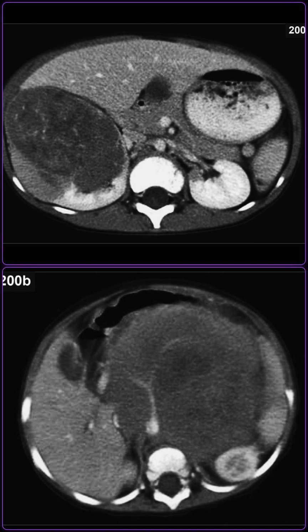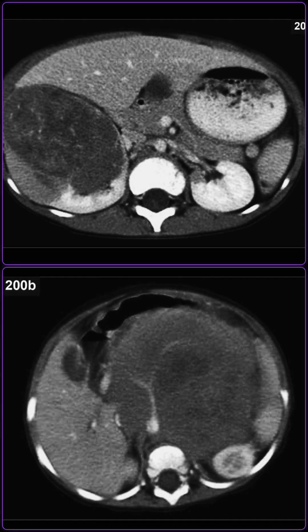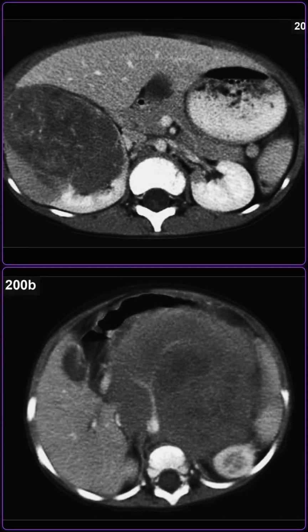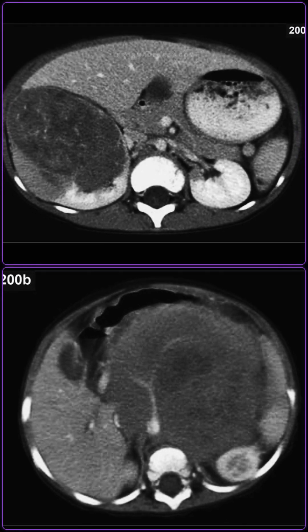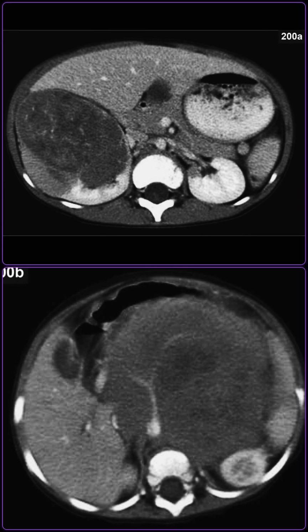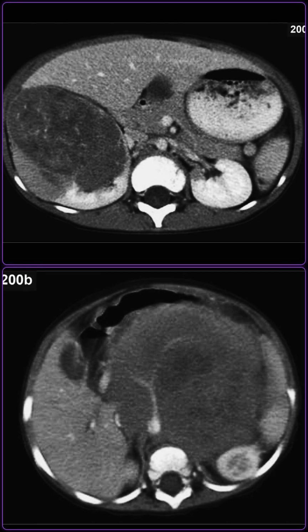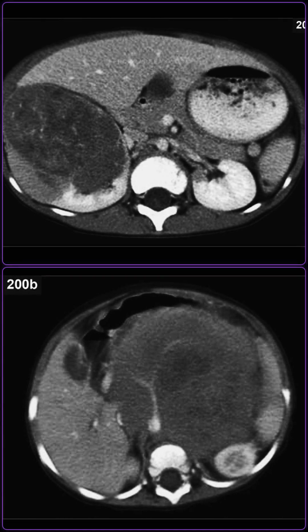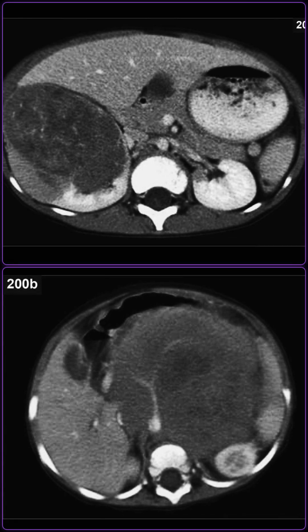As a radiologist, I would recommend comparing these CT images with prior renal ultrasounds or chest radiographs to screen for pulmonary metastases, which is the most common site of distant spread. I would suggest performing a detailed chest CT to exclude small pulmonary nodules. I would recommend evaluating the patency of the renal veins and the inferior vena cava using CT venography or Doppler ultrasound. Finally, I would document the findings, assess for signs of nephroblastomatosis, and refer the patient immediately to pediatric oncology and pediatric surgery for multidisciplinary staging and treatment planning.